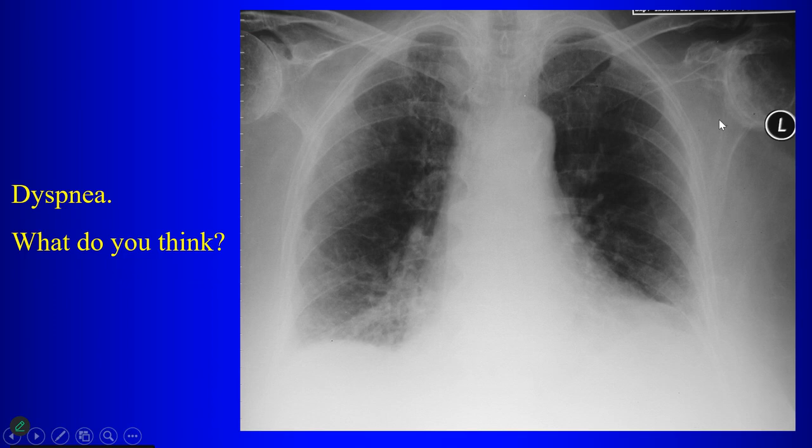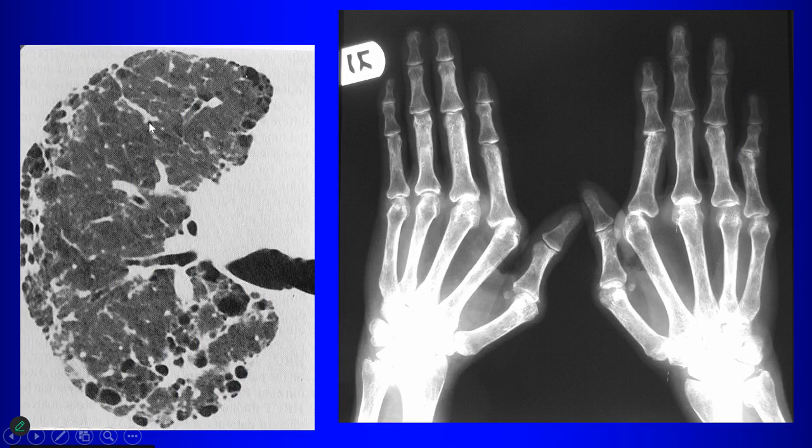So with rheumatoid arthritis, it's a bilateral symmetric disease. Okay. So you have narrowing of both shoulder joints, interstitial lung disease. This is rheumatoid arthritis. There's the hands. So this also can give you a UIP pattern. Honeycombing, subpleural distribution of fibrotic disease.